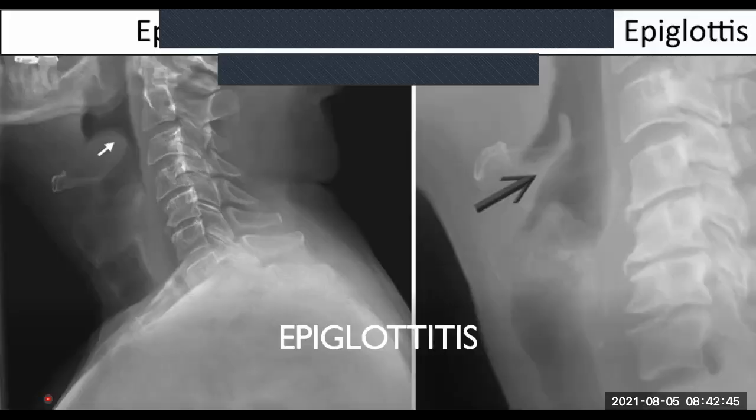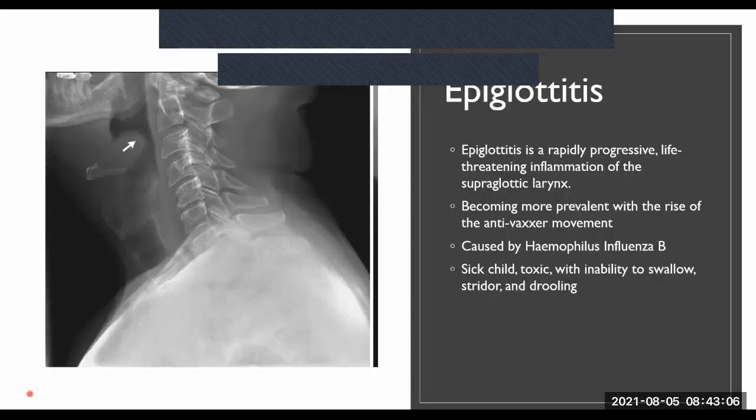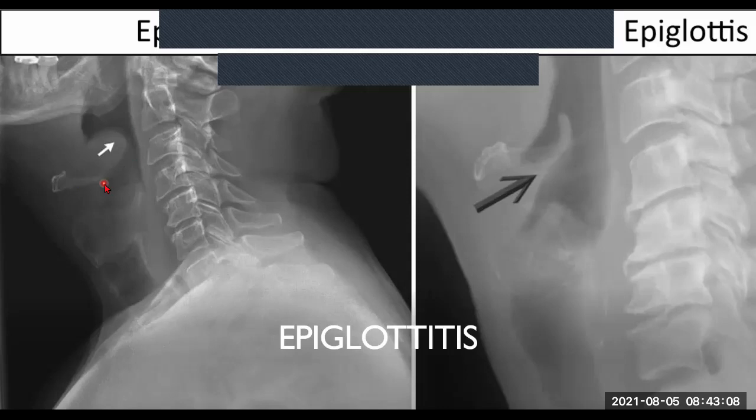All right, so this is epiglottitis, right? It's just cut off there at the top, okay? So when we look at the X-ray, what do you notice about the epiglottis compared to the one that we saw before? Considering this is a normal one. Yeah, very good. What does it look like? Yeah, now it really looks like a thumb. So this is the proper hitchhiker's sign, all right? This one here, not so much. Oops, sorry. Go back. So when you see this, that's epiglottitis, okay?